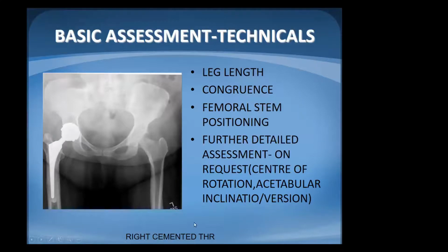Now, what we've discussed, length and congruence, are very important. You can see the good congruence between the femoral component and the acetabular component with good positioning.